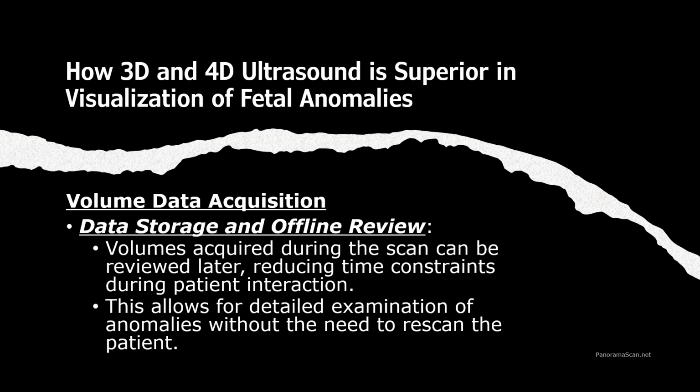This feature is particularly valuable in clinical practice as it reduces the time pressure during patient interaction. It allows for a detailed examination of anomalies without the need to rescan the patient, offering flexibility for thorough assessment and decision making.